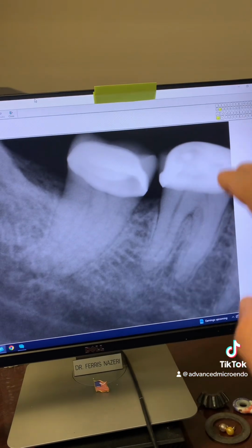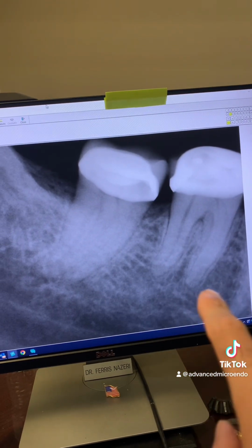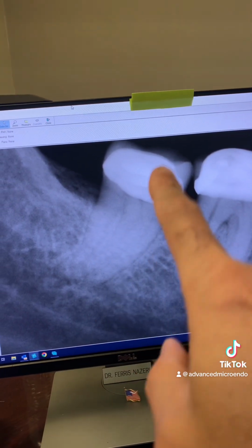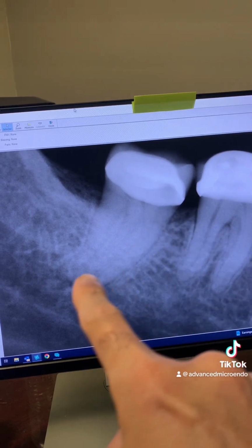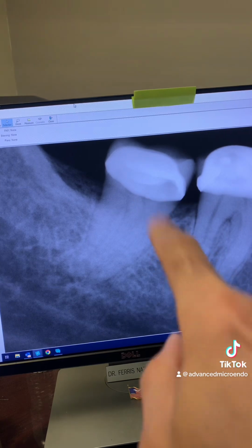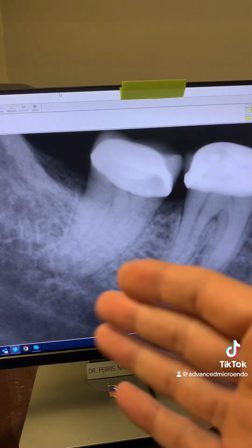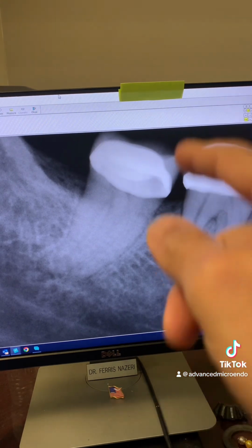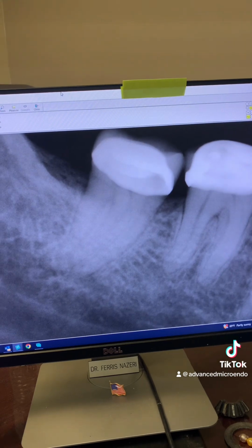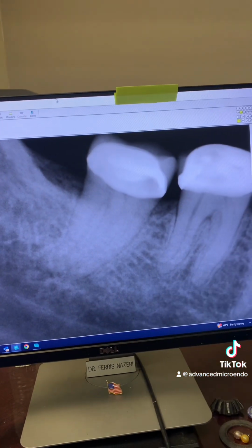Later, the same patient came to see me for tooth number 30, and I'll show you the following year, 2015. So take a look here. 2014, 9 years ago, for endodontic treatment of tooth number 31. As you can see, periapical lucency associated with the tooth, crown on the tooth. We talked about options. The patient said he wanted to try to save the tooth, so we went through the crown and did the root canal in one appointment.